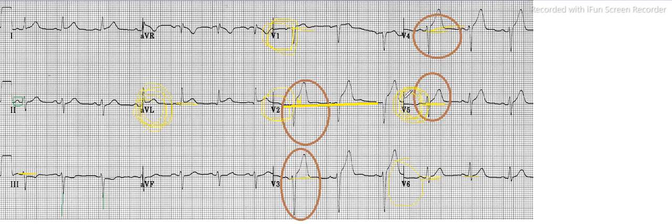So basically there must be some occlusion in the proximal left coronary artery, that is before the bifurcation of the left circumflex artery. So while localizing, that could be the region. However, there is extensive LAD occlusion, because some degree of septal portion is also involved, so it must be proximal.